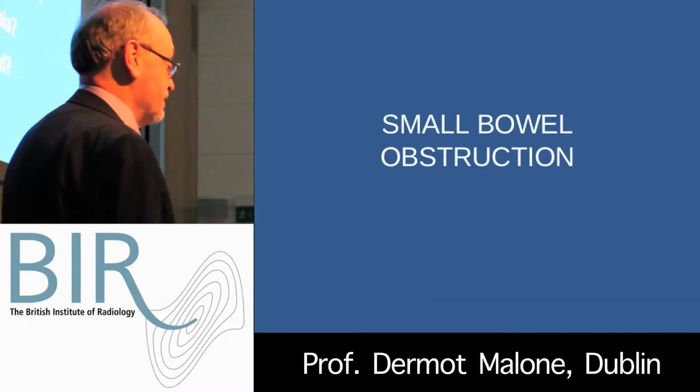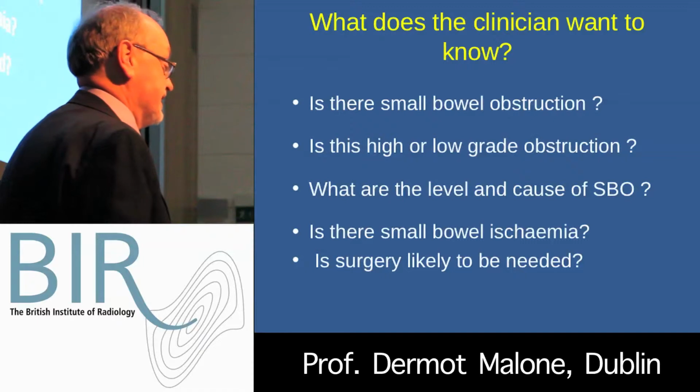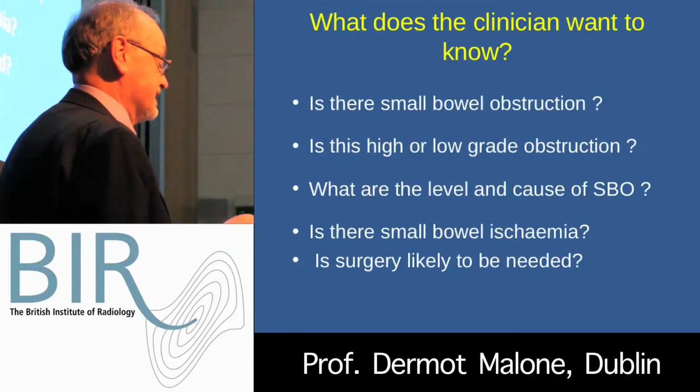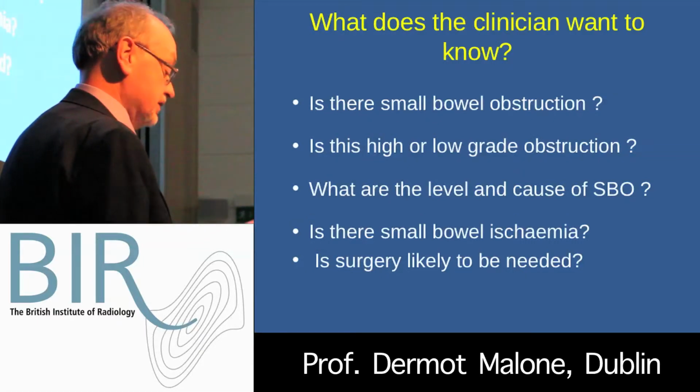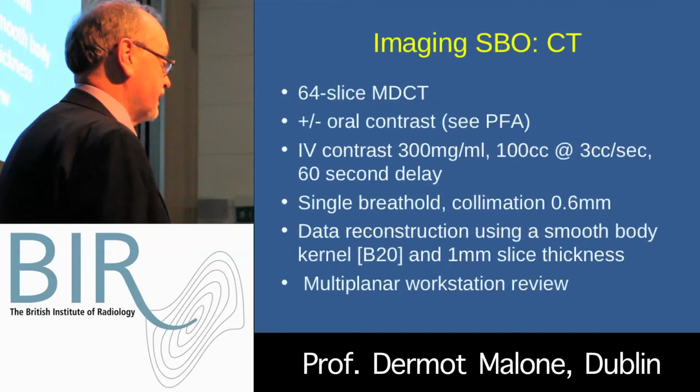We'll start with small bowel obstruction. And the clinician wants the answers to 5 questions really here. Is there small bowel obstruction? Is it a high or low grade obstruction? What are the level and cause? And is there ischemia? Is surgery likely to be needed?